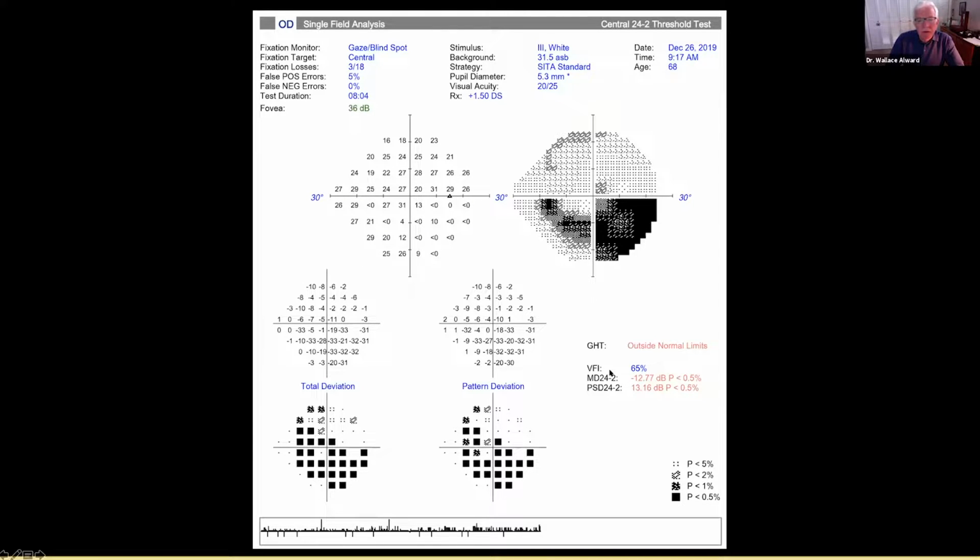So here's a patient who comes in with a field defect that looks like an inferior arcuate defect, except it looks odd. So, blind spot, inferior arcuate, nasal step. But when you look at the Humphrey 24-2 printout, it's like the 30-2, except it got rid of the last row of test sites, except nasally, because obviously for a glaucoma field, nasally is what's important. What you're noticing is that the blind spot is on the nasal side of this patient's field. So you see a field like this, blind spot here, left eye, but this is the right eye.